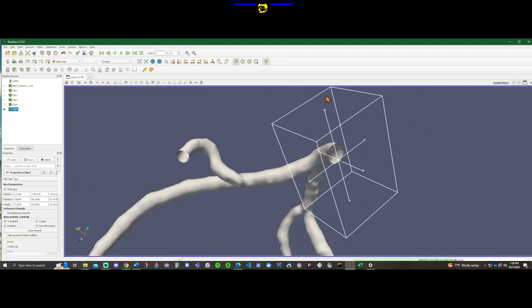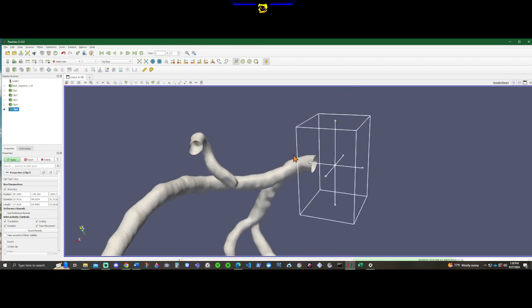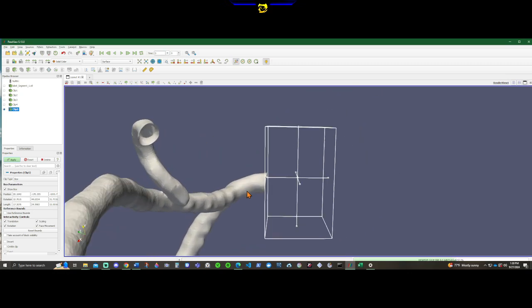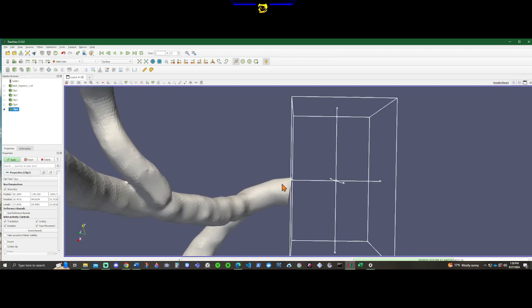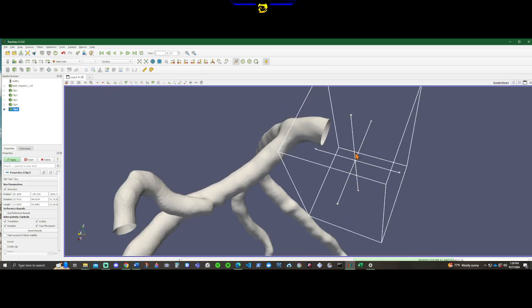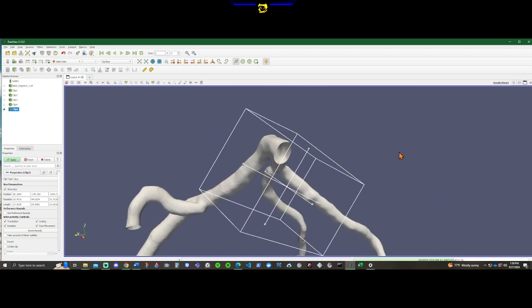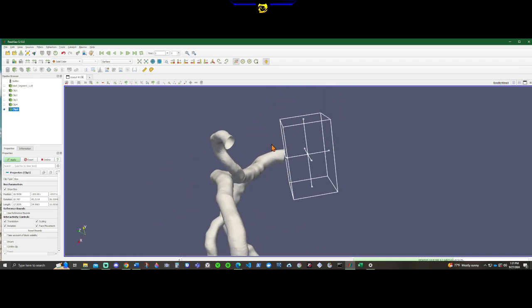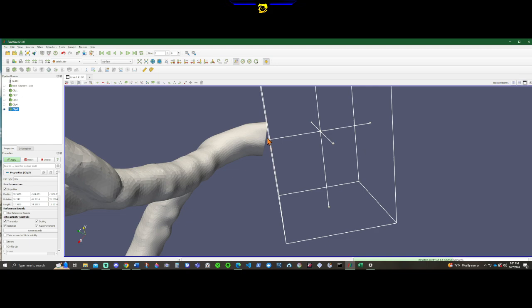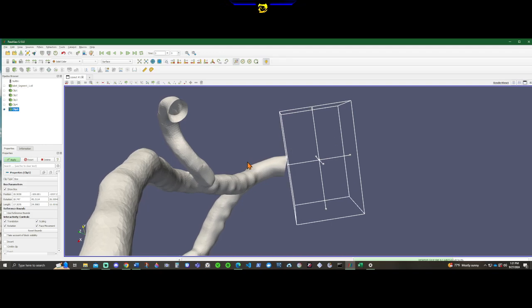So I'm going to push that forward a little bit. Yeah. See that? How it's like leaning forward? You don't want that. So you want it more perpendicular. So this again, so it needs more. So let me do that. Let me push this a little bit more that way. Yeah, you really don't want something like this where it's at an angle. So now let's check in again.